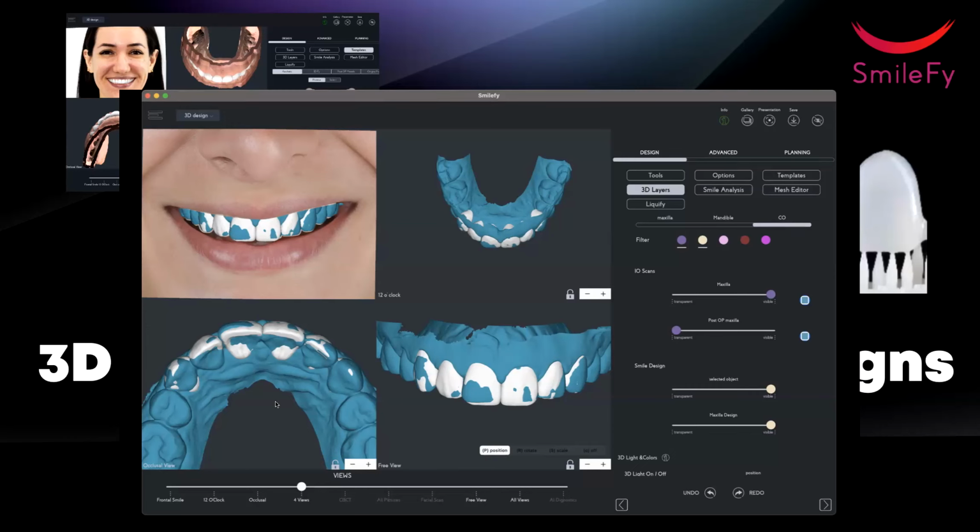put in the mouth of the patient, and prep through the mock-up, following the Galip Gurel principle of aesthetic restorations. Having the ideal design, creating the mock-up in the mouth of the patient, and now prepping the areas that go out of the design will help you not to over-prep the patient. It's a minimally invasive prep. Afterwards, you scan the prep of your patient and import it back into the project.